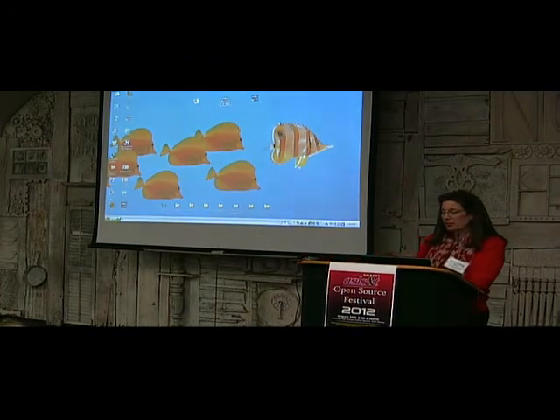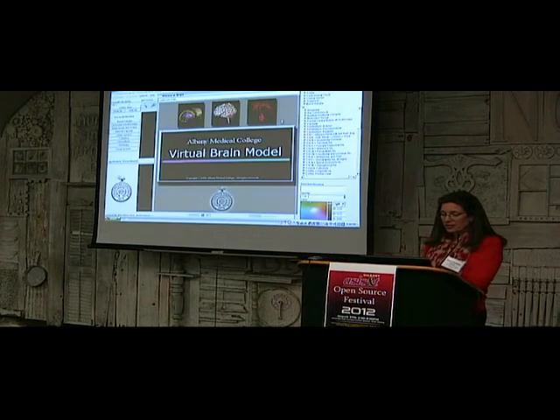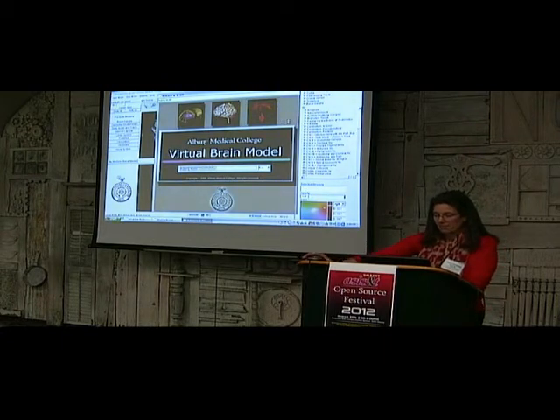So this is what the icon looks like on your desktop. You double click and it loads the database. It'll run faster on newer computers. Mine has a slower processor. But it takes between 30 seconds and 2 minutes to load the model. So we're watching it load. Agonizing. Okay.